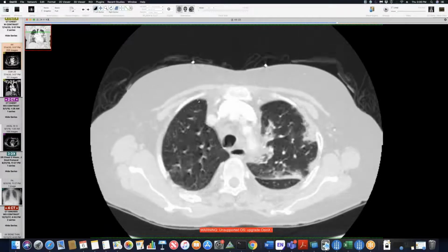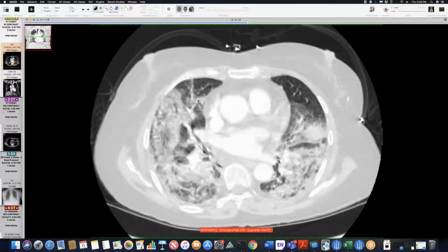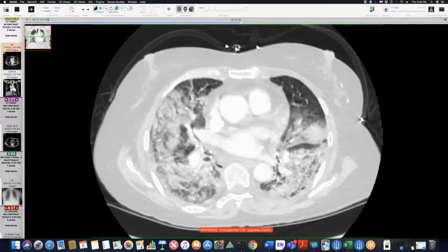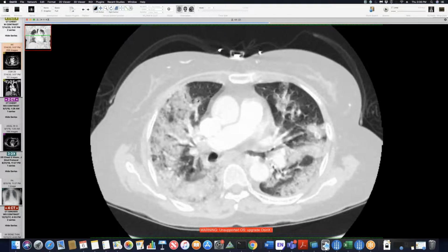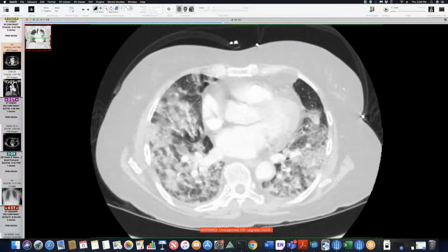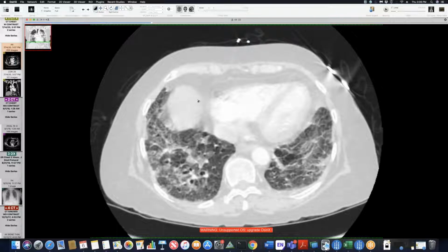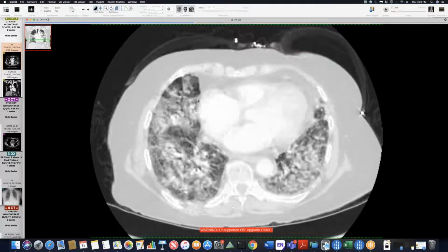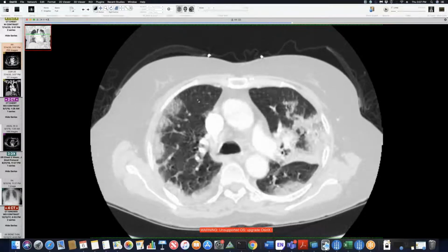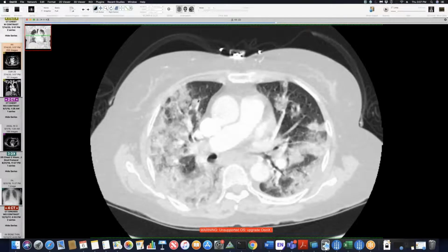So same patient. You don't see the nodules, but now you see all this consolidation. So in GPA, whenever I see diffuse consolidation, at least I'm thinking about DAH, but that's not what this was. The patient didn't have hemoptysis. They did have fevers for 1 week. So this was COVID. And it's not a huge surprise somebody with an autoimmune vasculitis is going to have a bad cytokine response to coronavirus in their lungs.